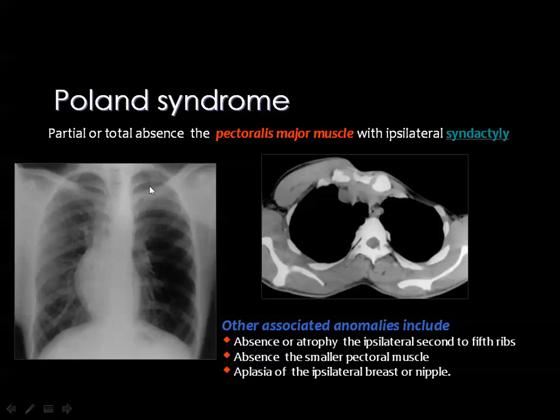And this radiolucency or hypertranslucency can be caused by too many other lesions, like removal of the breast in cases of mastectomy, and unilateral emphysema in cases of McLeod syndrome, for example, and too many other pathologies.